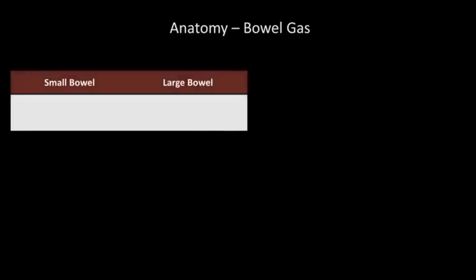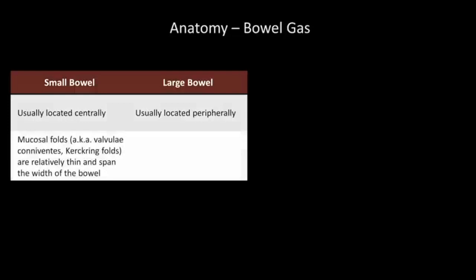Lastly, with air anteriorly in a supine patient, you can also get the falciform ligament sign. The falciform ligament is not usually seen on abdominal x-rays, but if there is air on either side of it, which there is here, you're going to see the falciform ligament pretty well.